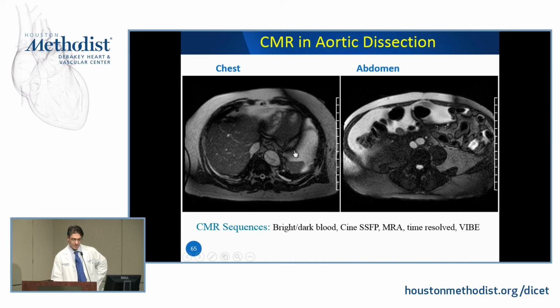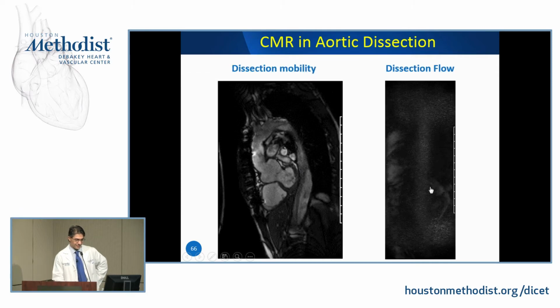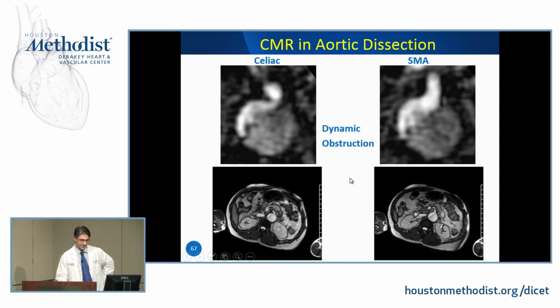I'm so sad it's not playing here, but it was really an amazing case, which, Akshay, you'll be reading today. It was a very nice type B dissection, and you had a retroesophageal right subclavian, and you can see the dissection going into that as well. So I'll figure out why this didn't work. I'm really disappointed. And it's the same story over here.